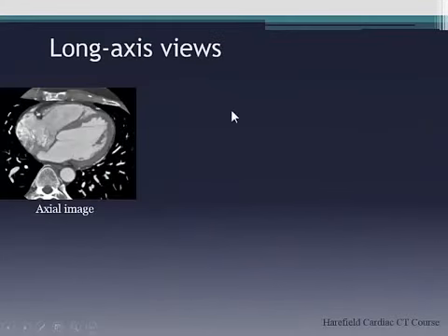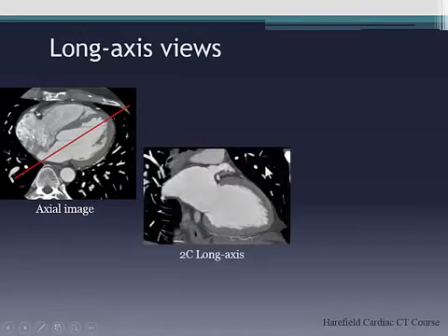So here's the axial image. When we cut through the mitral valve annulus and the LV apex, we're correcting for the first plane of obliquity, which gives us the vertical long axis or the long axis 2-chamber. Remember, this is not a proper 2-chamber because in a proper 2-chamber on echo or an MRI, you should really be cutting through the anterior and the inferior wall, okay? Because you've not planned this off the LVSA, you can't guarantee you're cutting through the anterior and the inferior wall.